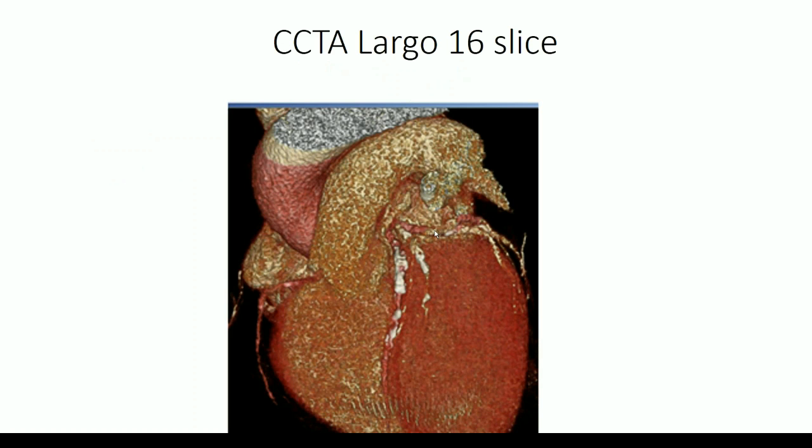Physical examination was normal. This gentleman, being part of a police department, basically had a contract where he could go get a CT scan at a minimal expense, like $199. So he went and got the CT scan, and here's what the picture looks like. You can see some calcium, and you can barely make out some coronary vessels. This was done with a 16 slice scan.